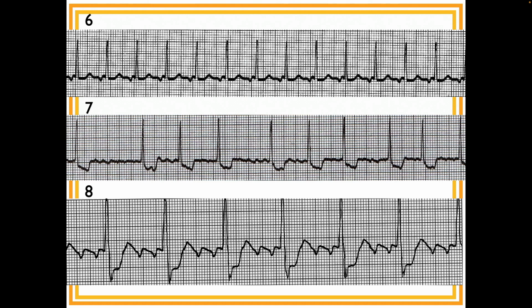Okay, so let me jump in there. When you say regularly irregular, what's the pattern that you're seeing? Certainly there's a lot of difference across, so you must be seeing a pattern. I see a clump here, a big gap, a 3-beat clump, and then this gap is also bigger, and then there's 3 beats, and then this gap.